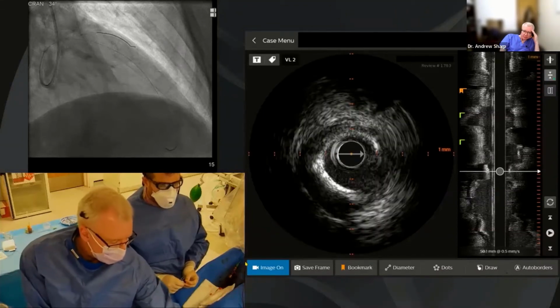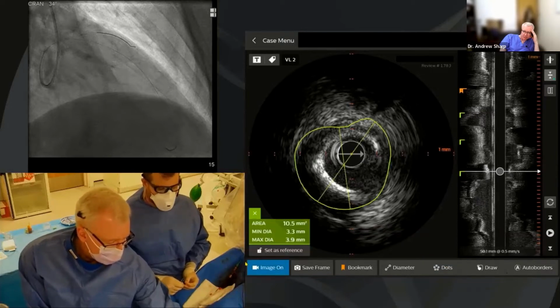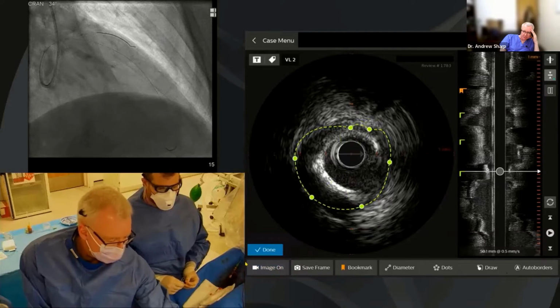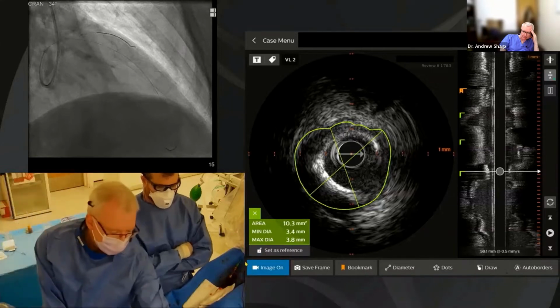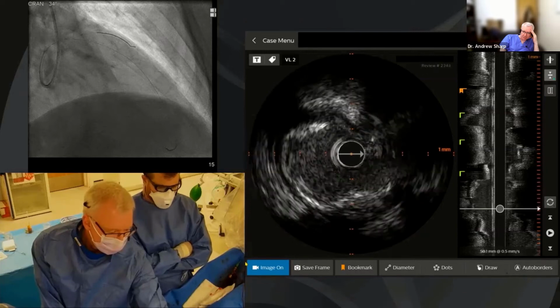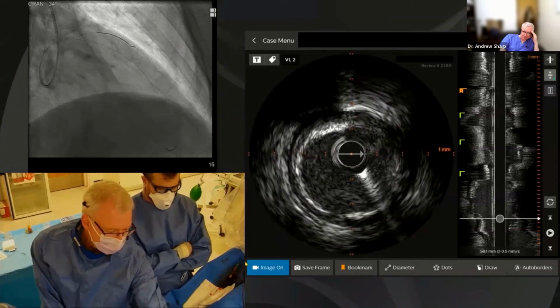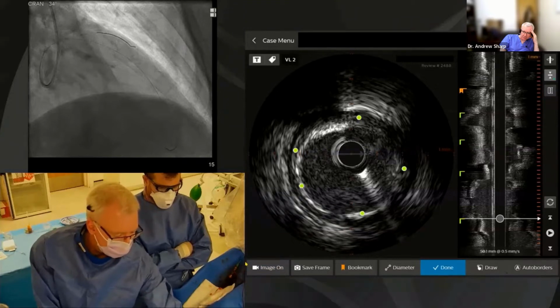You know, it used to be a bit bigger, but now it's a little smaller than the distal reference. And so we're always a little cautious about how aggressive we are within negatively remodeled segments. And then it goes up to 3.5 in the body of the lesion more proximally. And then we're coming back here for our landing zone, which should be 4.5 given that it was earlier.